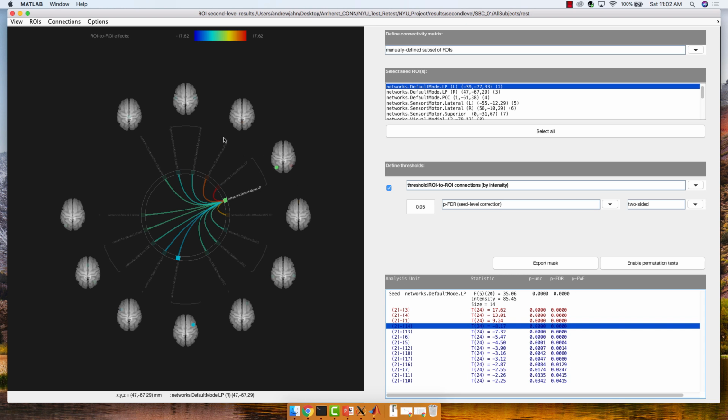It also tries to segment these according to which network they belong to. So I have different networks, and I have different nodes within that network, right? And these brackets are roughly corresponding to these different networks. So it's really hard to see. It's even hard for me to see on my computer. But you can export this and blow it up, make it a little bit more readable.